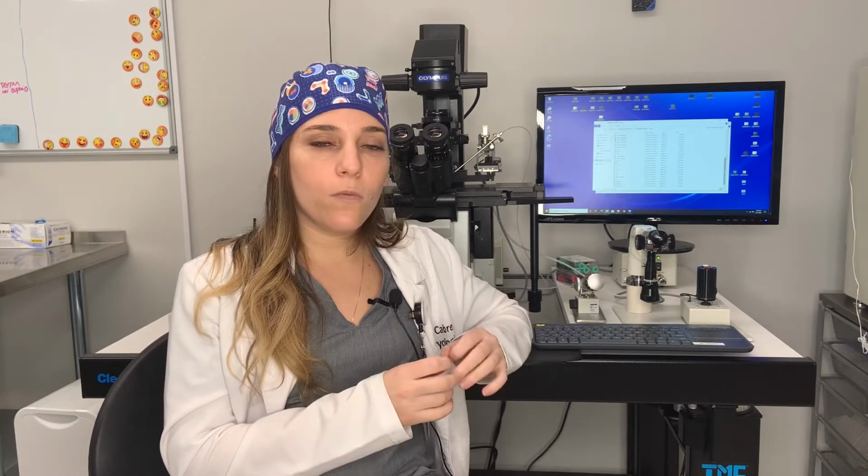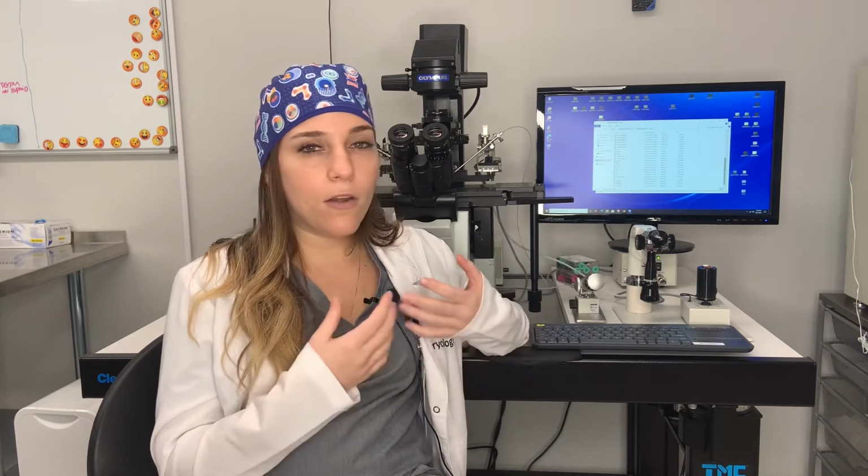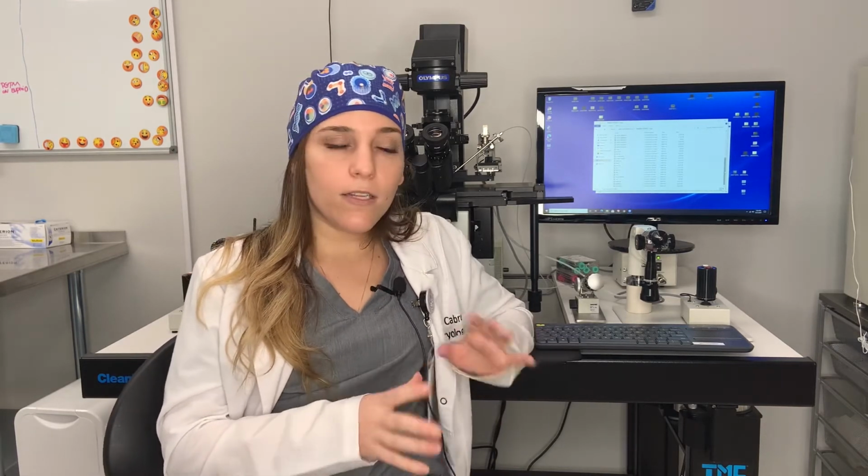Grades 1, 2, and 3 solely depend on the blastomeres, the cells inside the embryo, whether they are symmetrical or not symmetrical. Also, we take into account fragmentation, and we do that based on percentages. Less than 10%, over 25%, somewhere in the middle is where we'd like, in layman's terms, pretty much where we look at the embryo and assess it at.